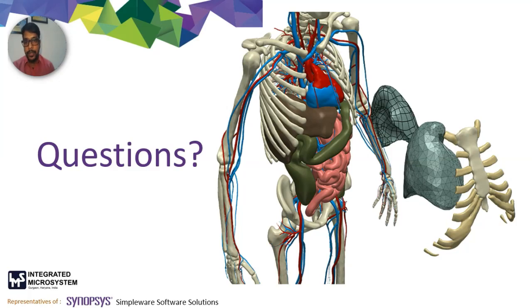As we know, the segmentation of the cardiovascular system can be a very complex and very time-consuming process. Just to give you an example, an expert user could take around 3 to 4 to 5 hours for the segmentation of the cardiovascular system, and the automated system does it well under 2 minutes, and that is a significant amount of high-value engineering time saved by using these automated solutions.